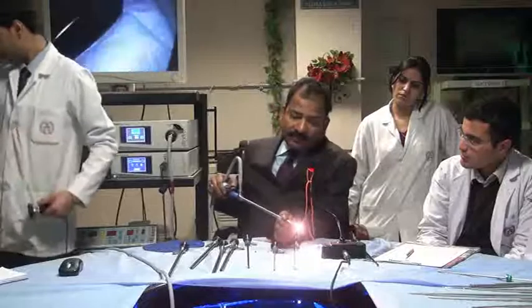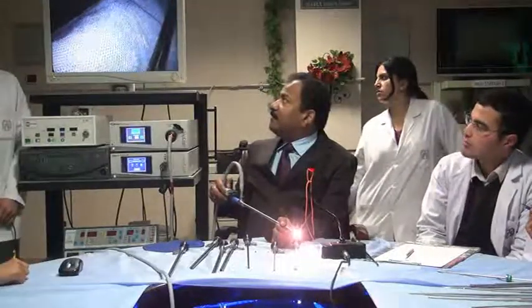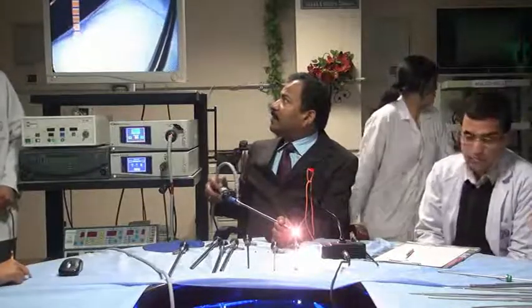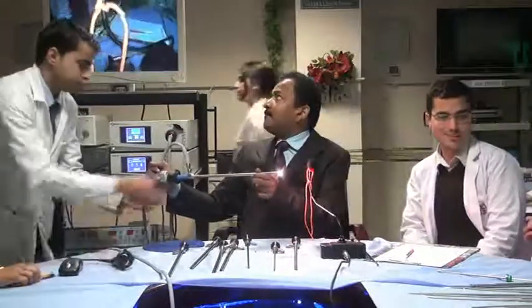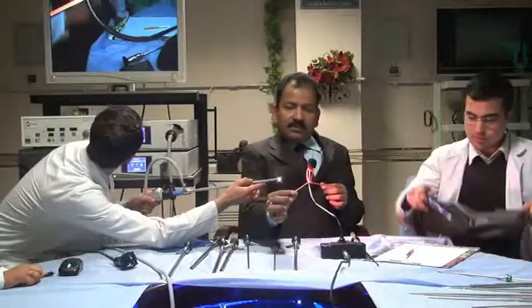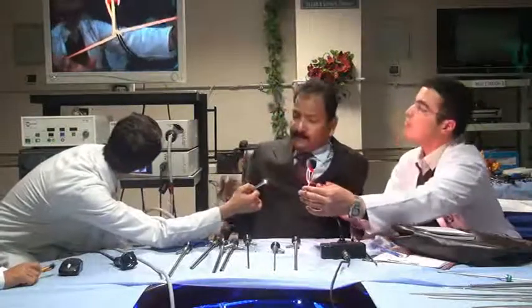Yes, if you put it directly over, it can create retinal injury, meaning some burn can be there. So I will demonstrate. Now suppose this is there. Can you help me to hold it like this? Just support this side.